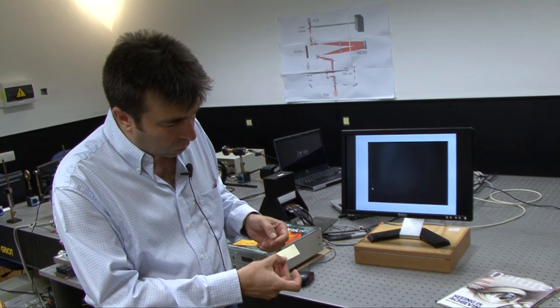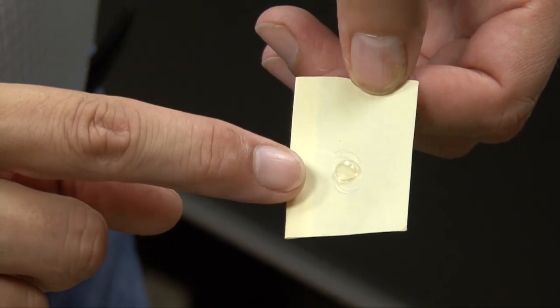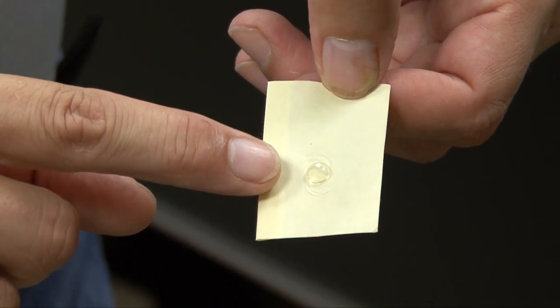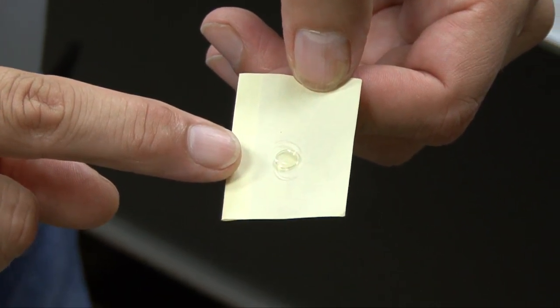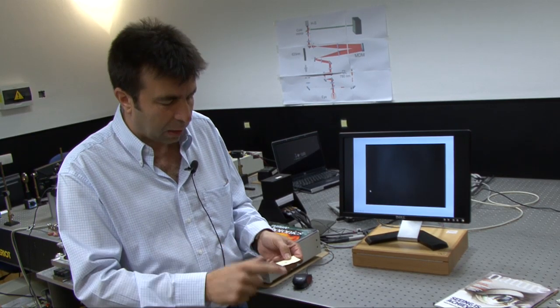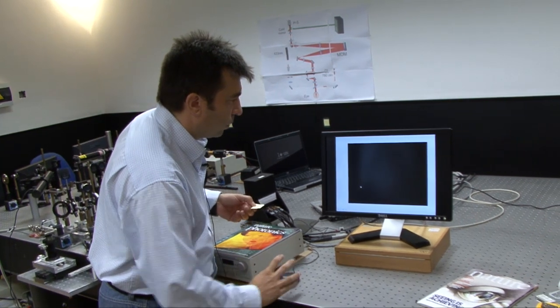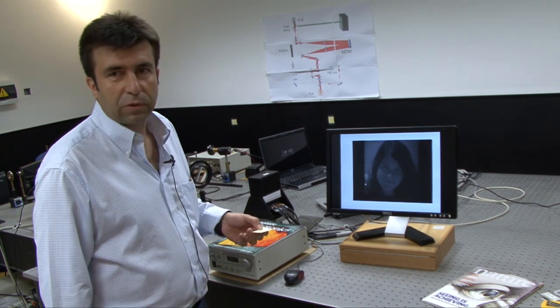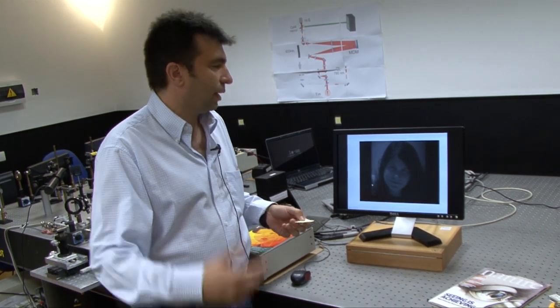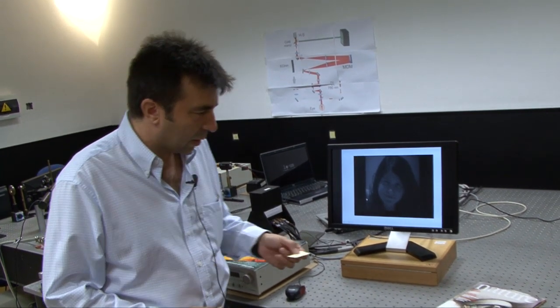They are called intraocular lenses. When this person has these intraocular lenses, by the way, we are using our instrument to design new, improved types of these intraocular lenses. Many people in the world have the lenses that we are designing here. What is the vision then? Something like this, before and after the surgery. Before, they can see nothing. After, they can see practically the same as when they were young.